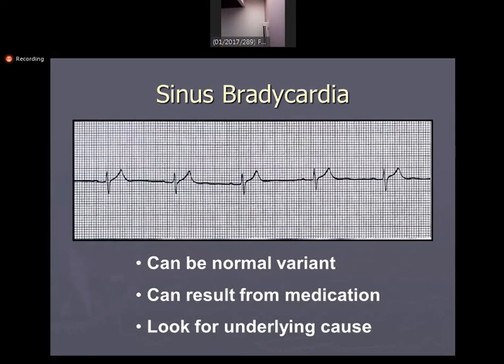It means it is a regular rhythm. So now, if anybody shows you an ECG like this, what will you say? It is a normal sinus rhythm showing bradycardia.